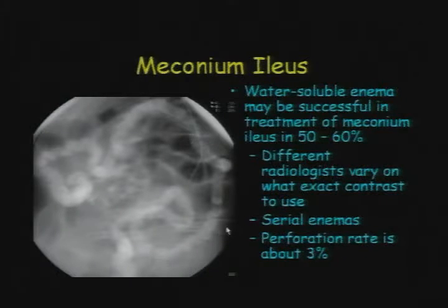Here's another case, a microcolon with filling defects as we're coming back here in the distal ileum. This is one of the things where radiology can be not only diagnostic but therapeutic.